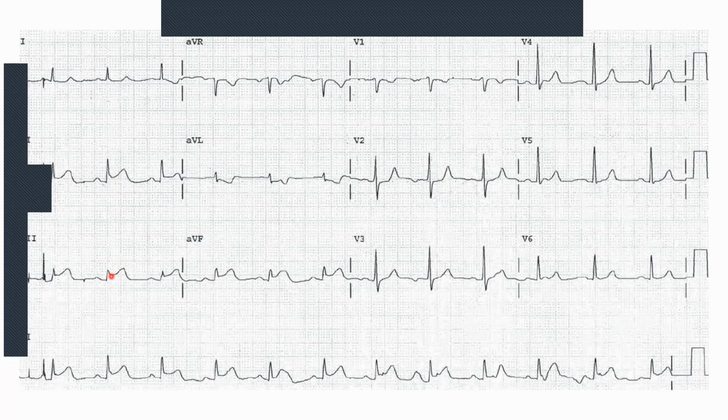So we've got an inferior, possibly a right-sided infarct that we may need to look at as well. Okay, let's look at the next ones that we have. So if we look at the septum, V1, V2, here we can see ST depressions that are occurring over there. So this could be reciprocal changes, or it could be something else, which we'll get to in a second.